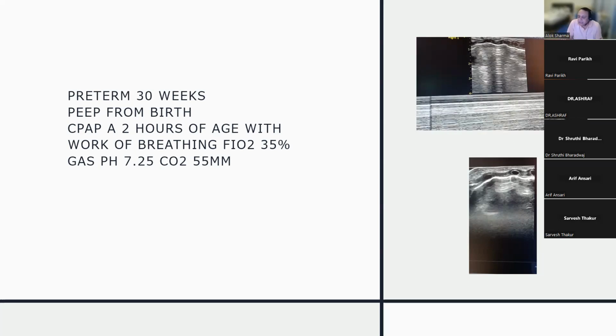Yeah, very good. So when I look at R3 and R4, again, I see decent well aerated lung. When I hit R5, R6 and L5, L6, that's where I start getting what is an AB profile with a lot of lung spared region. But dominantly, I'd say an element of a B profile, but no subpleural consolidations in any of these regions. By this, now you don't need full surfactant.